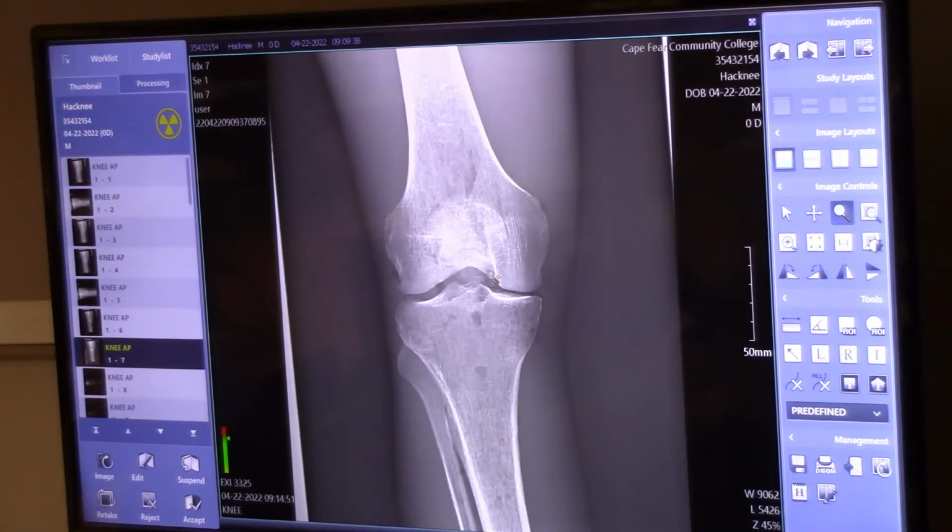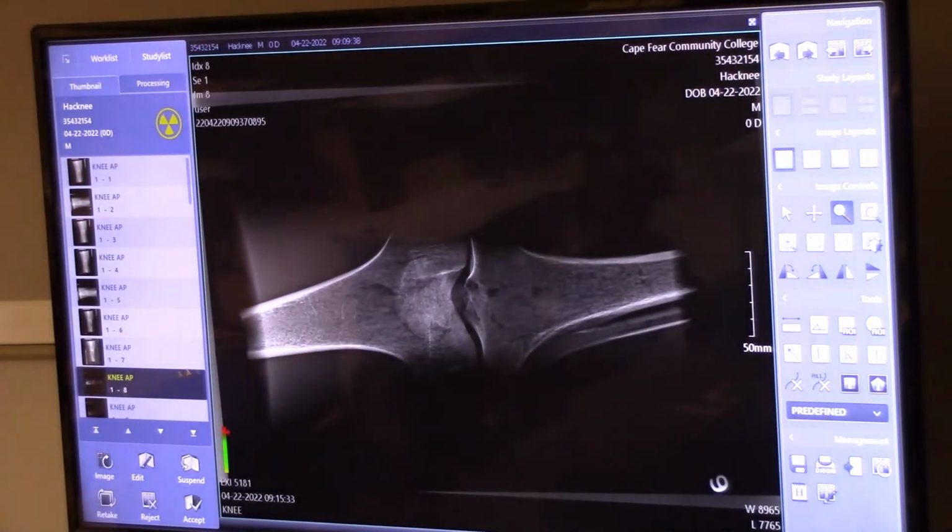So we're going to make ourselves a note. Don't shoot like that again, because this is like getting into red territory, overexposure. So that was what, 19 mAs? Okay, 19 mAs. We're pushing the envelope here, but we got away with it. Okay, what was our next exposure? This was number 6. Okay, this was at 39 mAs.